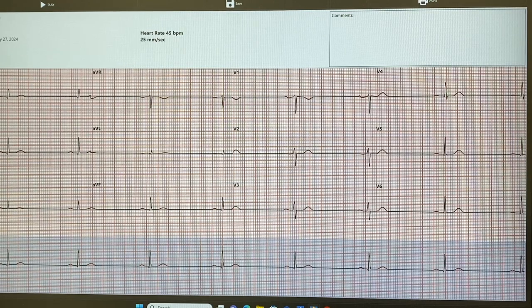Next, we're looking at the ST segment at the baseline. That's not really part of the analysis of the dysrhythmia, just so you know. We're looking to see if there's underlying ischemia or infarction. It's just part of the method of looking at a 12 lead, but you don't need to do that if you're just analyzing the rhythm. It's a standard that we always look at. The ST segment is from here to here. Is it at baseline, higher than baseline, or lower than baseline? Baseline. So we're not concerned about any infarction or ischemia.